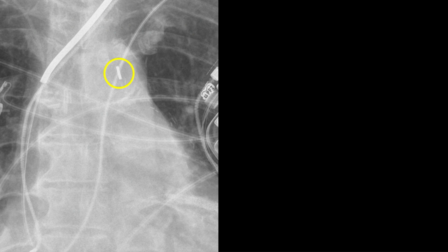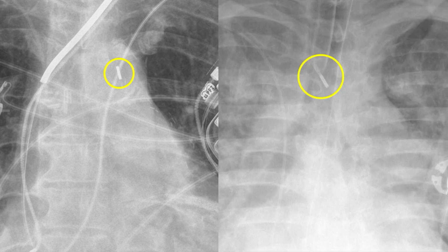So this is a typical marker overlying the aortic arch. It's about 4 centimeters in length. I've magnified it up. This is one of those dual density markers. I don't know if you use them in our institution. We tend not to, but some of the patients that come in from outside with the catheters in will have these. I actually like these because when they're dual density like that, I know that this is the distal marker. They never make dual density proximal markers, apparently. So when I see that, I know that's the end of the balloon.